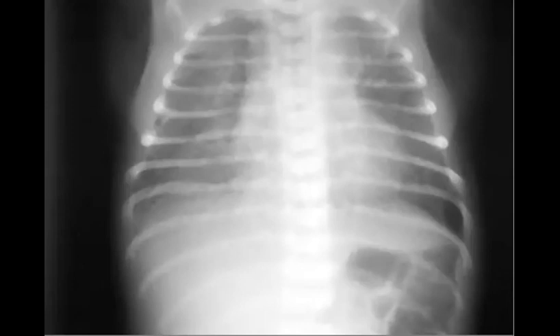So first approach, you can ask yourself, is it a term or post-term? Is it a pre-term or post-term? Yes. Ala, welcome. Thank you for responding. Okay, bilateral lung opacity. Yes. So Nermeen, welcome again. Nice that you mentioned lung volume.